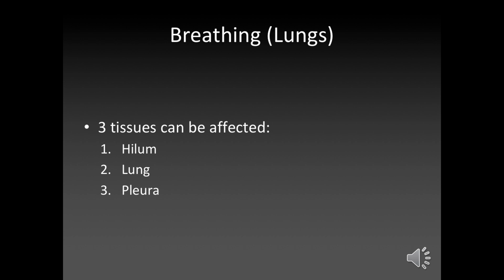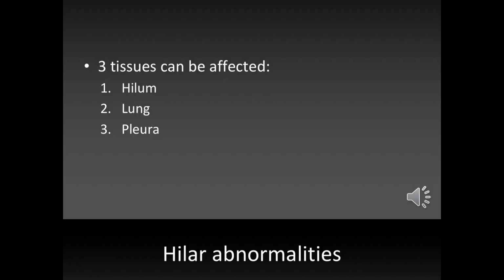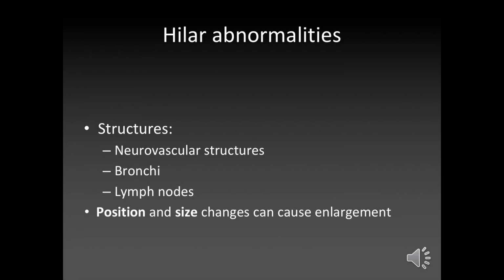So, breathing, which is essentially the lungs. And the three bits of the lungs. There's the lung itself, there's the hilum of the lungs, and there's the pleura. They're the three things that you look at in lung. Once you cover those, you're golden.